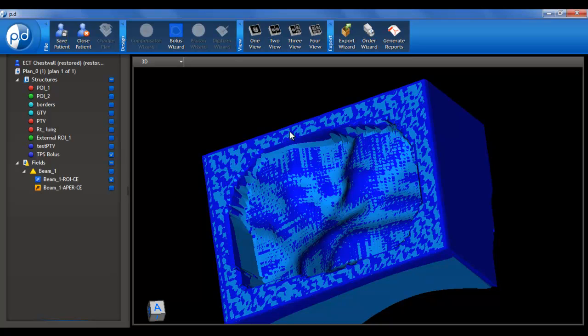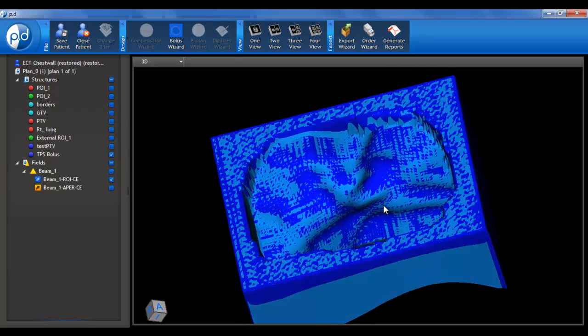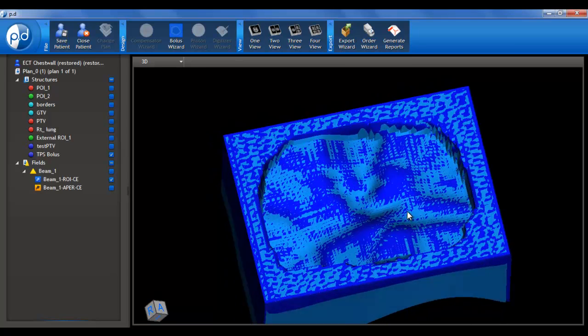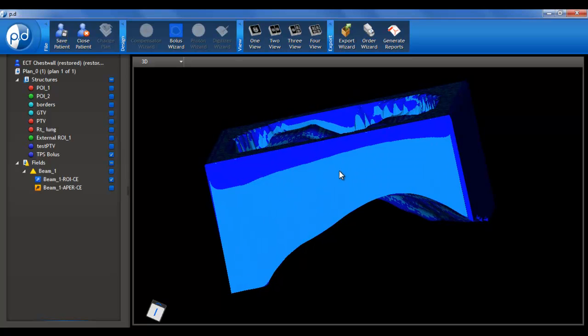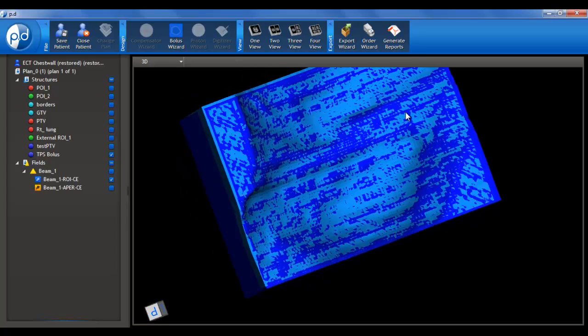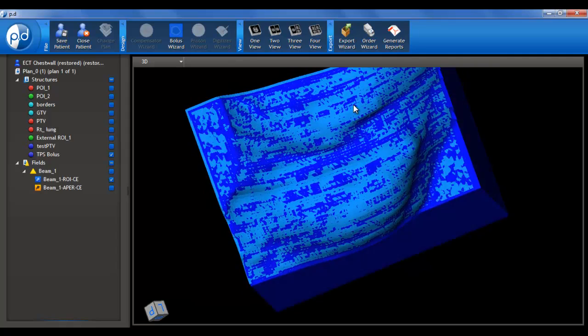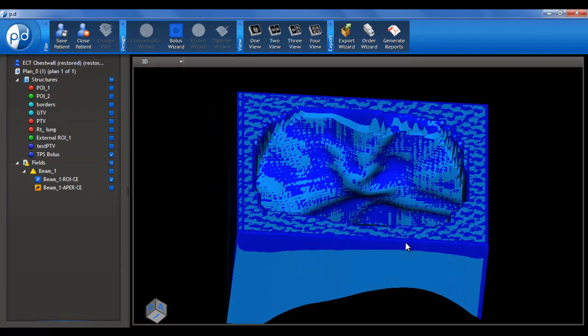So when we see this sort of blending, especially in these flat areas, it basically means the surfaces are on top of each other. The computer can't even distinguish which one to show above the other because they are so similar. So that's typically a good sign when we see that sort of flickering and we see that nearly random pattern of colors there. We see on the edges, though, that it's very clear that one is sort of outside the other. On the right here, it's very clear that the dark blue is slightly past the light blue. If we look at the patient side surface, again, we see that mismatch of colors, which tells us that they're pretty much on top of each other. That's really all we can tell from the 3D view.